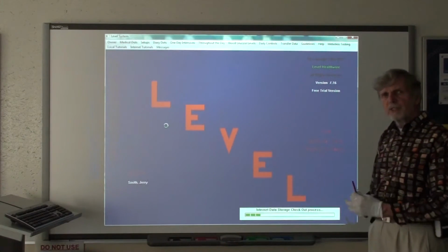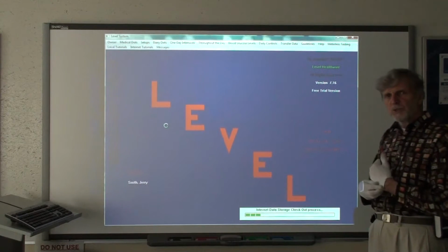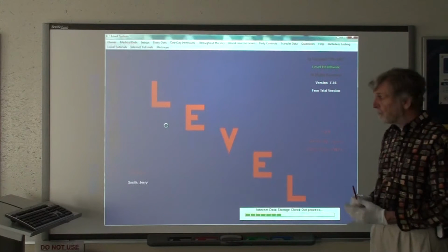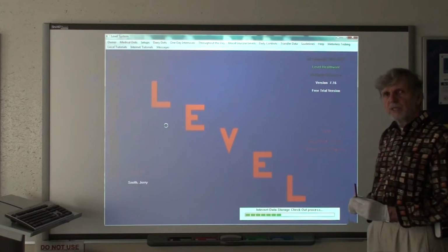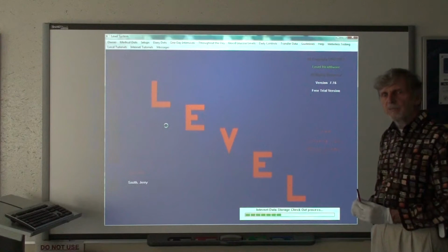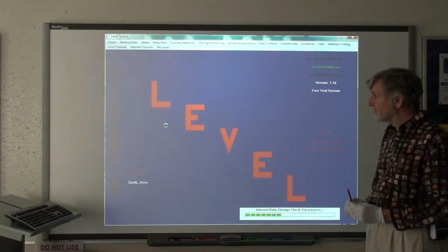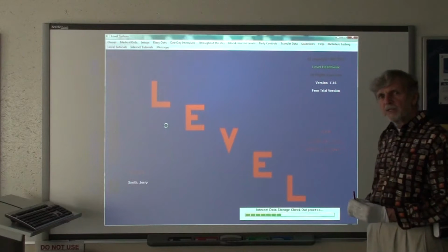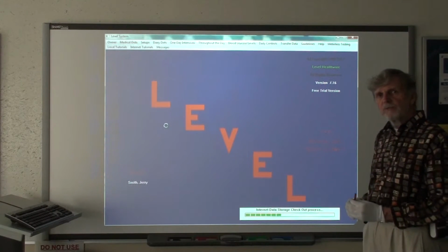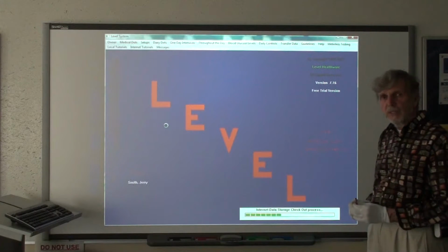Now, while Jerry Smith's data is being fetched from the internet data storage location where he put it himself, let's notice that his data is immediately up to date. It has the very latest data items that he put there himself for you now to look at. That is a huge advantage of using internet data storage, is that your view of his data is absolutely current.